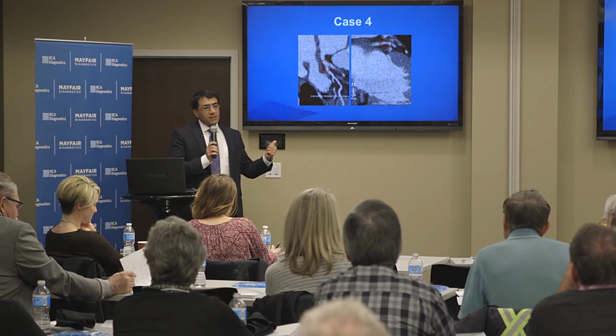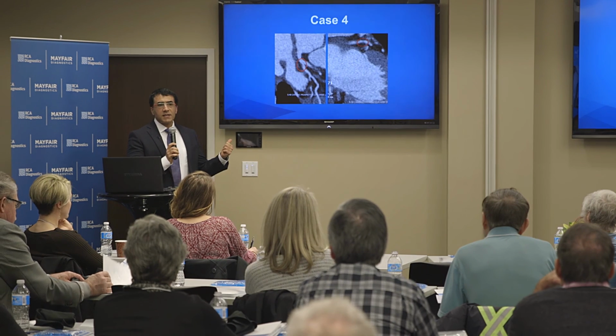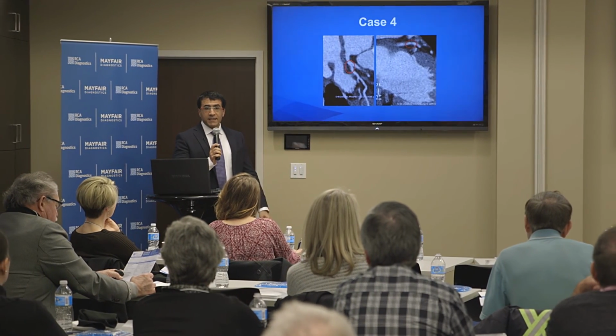And it's important to know that if we had done a calcium score for this person, this plaque is not calcified. It would be negative. Like the calcium score was 0 in this patient, even though there was a plaque and it was the indicator of presence of coronary artery disease. All right, so this patient is going to get medical treatment, as we saw from the clinic letter.